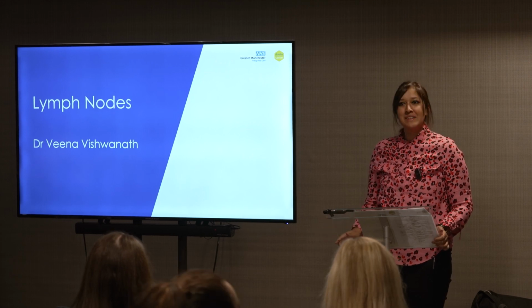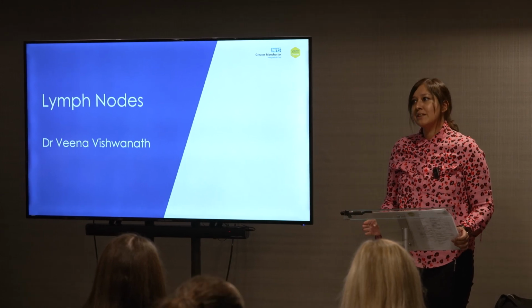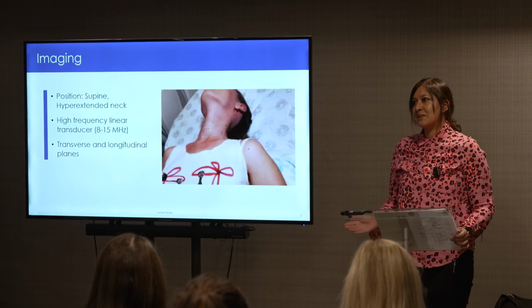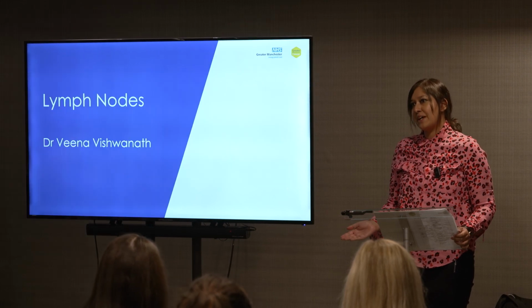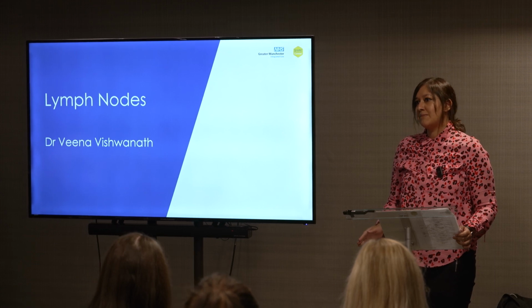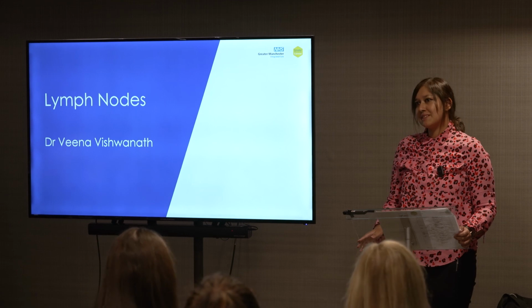It covered a lot of what I was going to present as well. But what I do want to focus on is showing you lots of pictures of normal versus abnormal. You'll find that a lot of miscellaneous things can present randomly at levels of the neck. So I'm just going to show you lots of pictures and go through different pathologies. And then you've got a quiz by Michael that will, again, reinforce this.